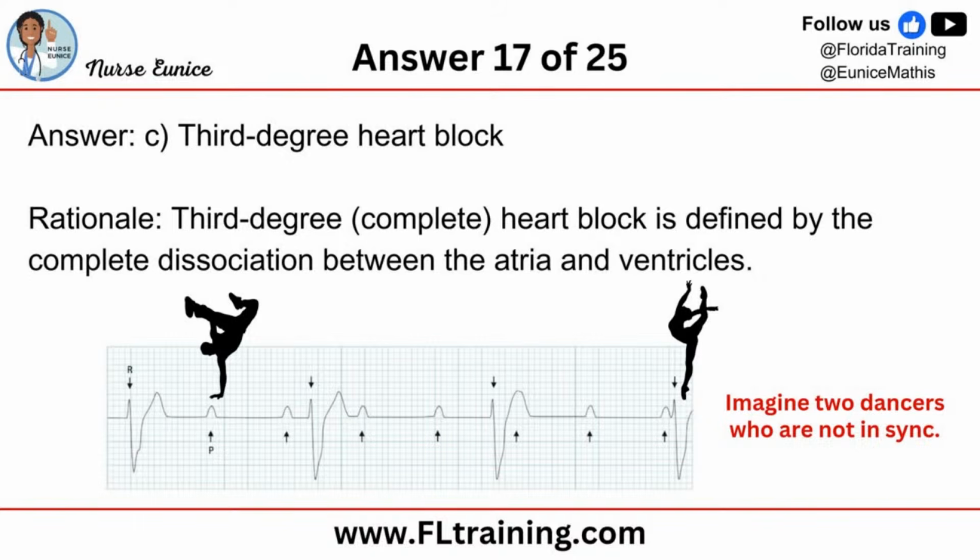And the breakdancer is just dancing at his own pace. There is nothing dropping. If you had your calipers and you march them out, your P to P intervals will be all the same. But look at our ventricles. Look at those wide and bizarre QRS complexes. That's a ballerina. She's going a little bit slower today. She's just taking her time doing her dance.